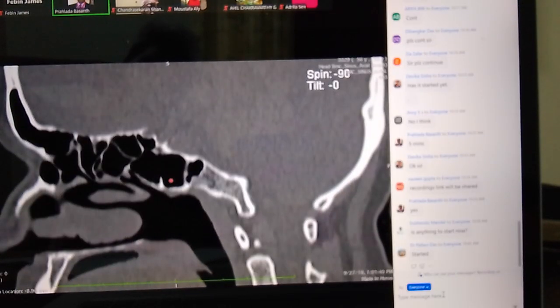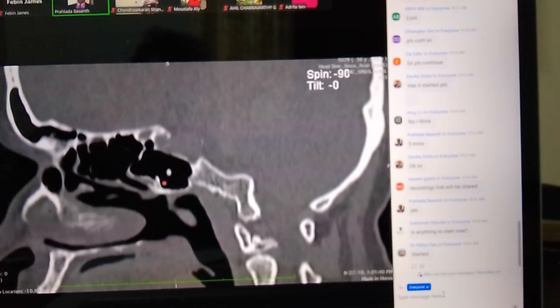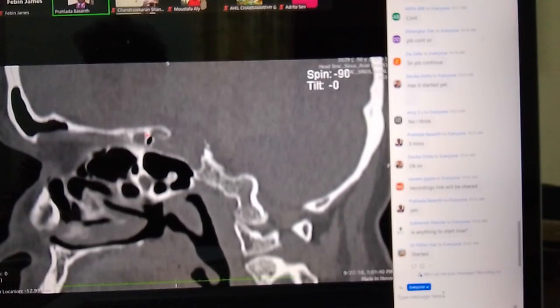We understand. Okay, yeah, this is sphenoid sinus. Let us come back. Okay, this may be the part of the canal. What is that? Pterygoid canal, the Vidian canal, which was projecting, if you remember in axial and coronal sections, it was projecting into it. Okay, this is the optic nerve now. Okay, this is the optic nerve now. Further we come back. Yeah, that was the Vidian canal. Okay, Vidian canal, and this is the optic nerve.